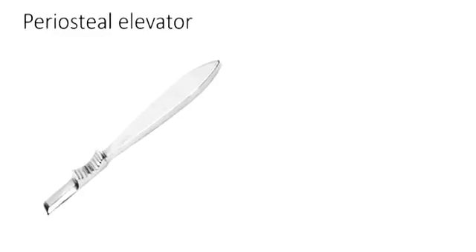Now periosteal elevator. The periosteal elevator is used to elevate the periosteum. Elevation of the periosteum is necessary in all operations on the bone because all the important structures such as vessels, nerves, tendons, etc. are outside the periosteum, and therefore once the periosteum is elevated, the surgeon is in a safe plane. All the muscles of the extremities are attached to the periosteum and are lifted off the bone with the periosteum. The periosteum is not elevated in some operations such as excision of osteochondroma, where the periosteum is excised with the osteochondroma to avoid recurrence. Periosteal elevators are of different shapes and sizes depending upon their uses.